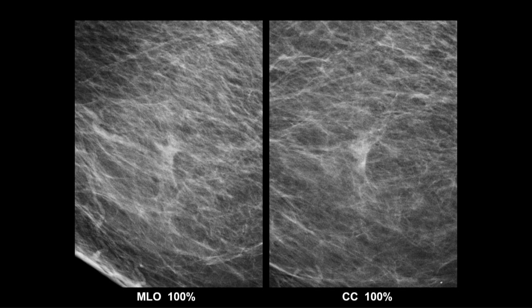If you have tomo in addition to 2D mammo, then you may be able to see the interspersed fat better than if you don't have that available to you. But basically, when you see concave outward contour, you're dealing with a focal asymmetry, whereas if you see convex, it's a mass. Masses are more suspicious than focal asymmetry because masses are much more likely to be, quote, tumors, where focal asymmetry is much more likely to be just an island of asymmetric fibroglandular breast tissue.